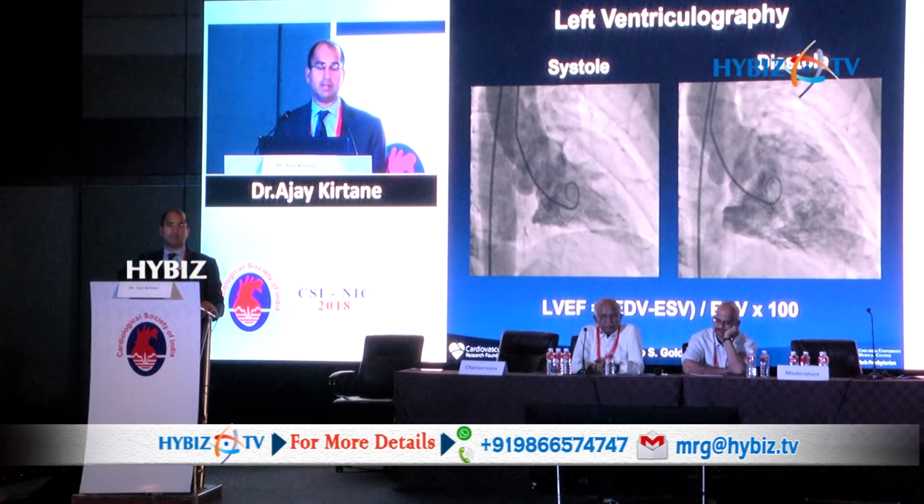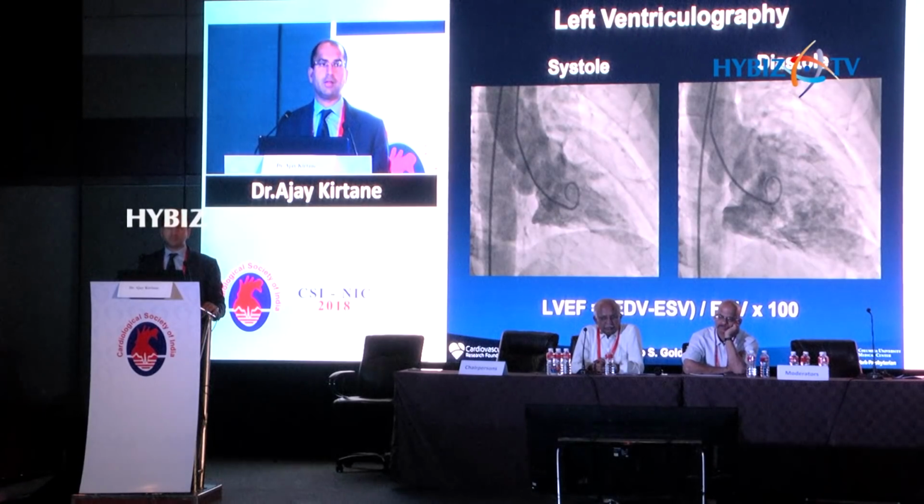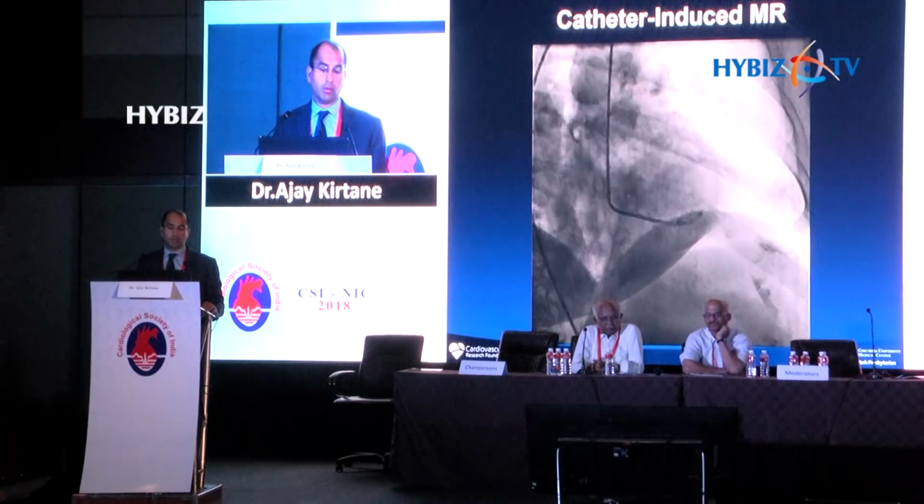And then finally, moving on to the end of this talk, I'll talk briefly about ventriculography. There are a lot of people who don't do this anymore. I do think it can be very useful in cases, particularly when you have not seen or done the echocardiogram yourself. You remember basically systole, diastole, you can calculate ejection fraction. In general, most of the time it's estimated. But there are other things that are important.